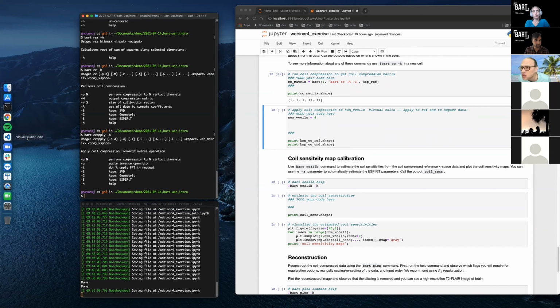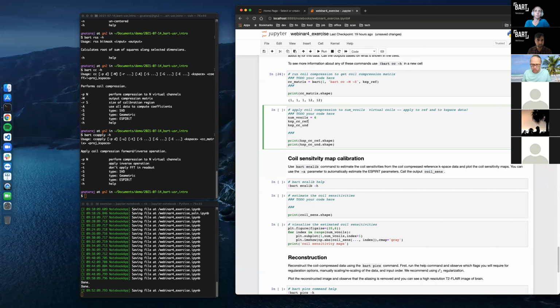And it looks like we're expecting the following names from the print command, so I'll help with that. So we can focus on the BART command. It's going to be BART, and it's going to be one output, I'm assuming.